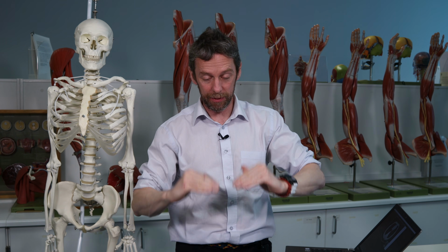So, yes, you can do this yourself, and it's a really good fun thing to do. Scroll up and down, have a look through this sequence of images, and try to take your three-dimensional knowledge of the body and apply it to essentially what are a series of two-dimensional images. And you don't have to look at it in transverse section, you can look at it in sagittal section or whatever. But have a look and see if you can recognize these structures.